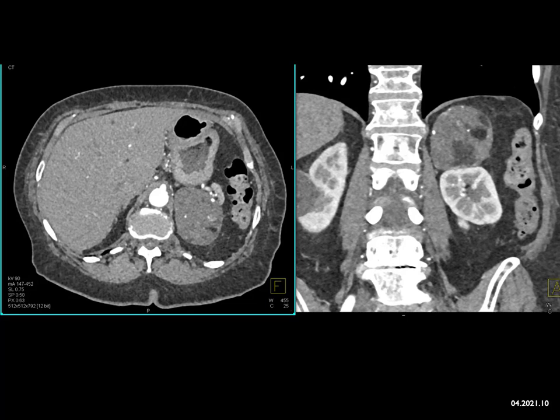I see a mass in the left adrenal. It contains high areas of fat. It also contains punctate calcifications. It has a little bit of mass effect. It's not a primary adrenal carcinoma. Yes, adrenal carcinomas occasionally can have fat, but then it's the dystrophic calcification and fat. It's irregular. It would be more enhancing.